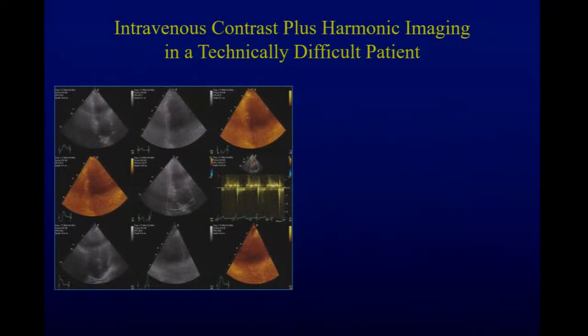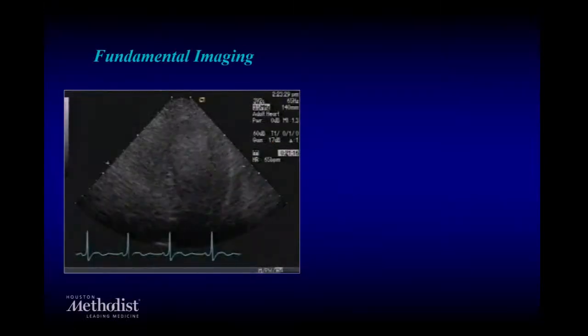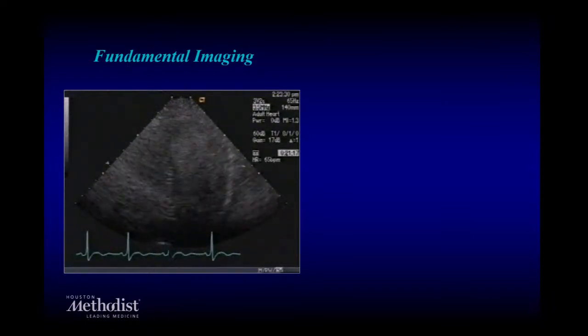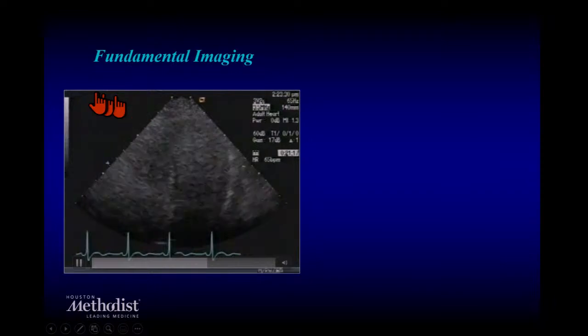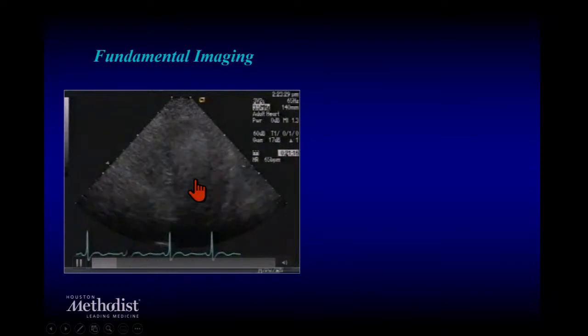Okay? Now, this is a bad image, no question about it. And if you use contrast, it can improve the image significantly, right? But we're going to talk about contrast per se down the line. But, to illustrate the issue, this is fundamental imaging of a contrast echo. Not the most pleasing, right? You could see contrast maybe in there in the middle. I could see the heart a little bit. That's about it.